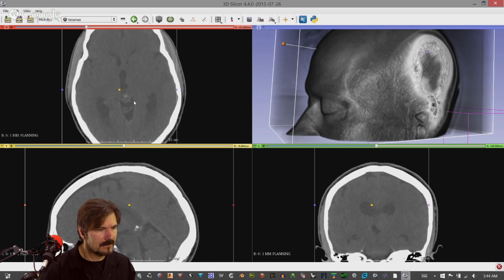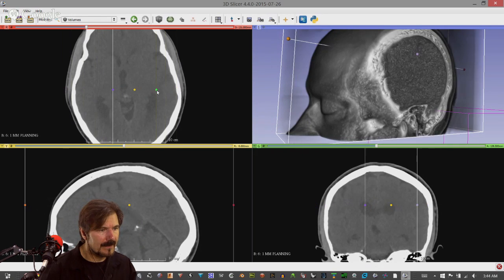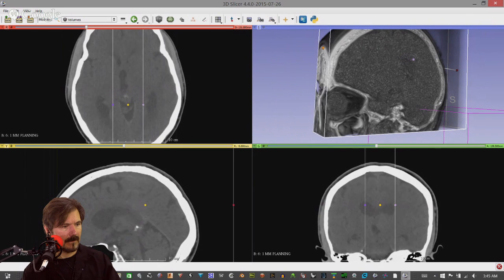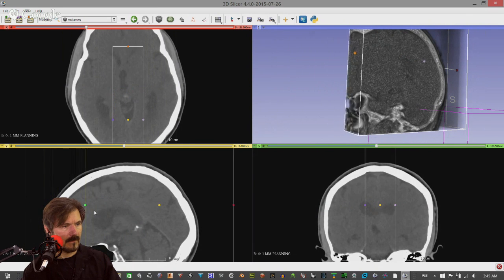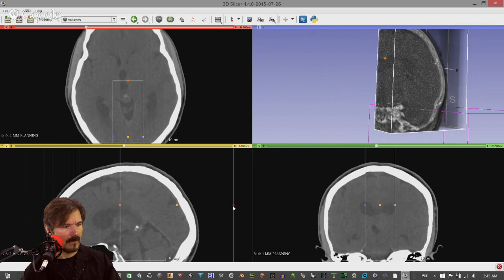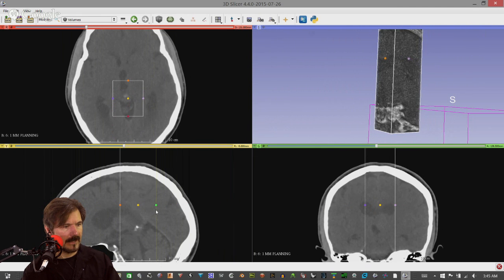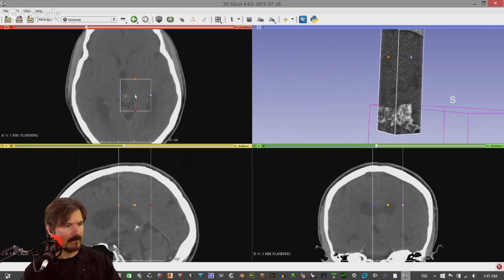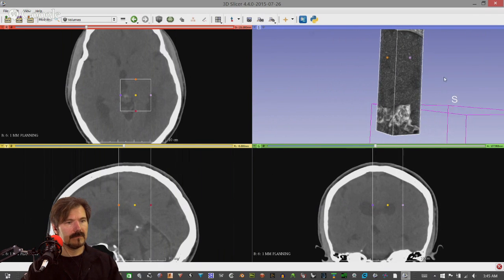And it's hard to see it from my screen onto yours. What I'm going to do is take my ROI and create a box around it. Is that about it? Yeah, yeah. In fact, if you move the yellow dot a little bit to the right, a little bit more, you're going to be essentially there. Exactly. It's going to be right in that area, and we'll examine it further on a few of these other cuts. Okay.